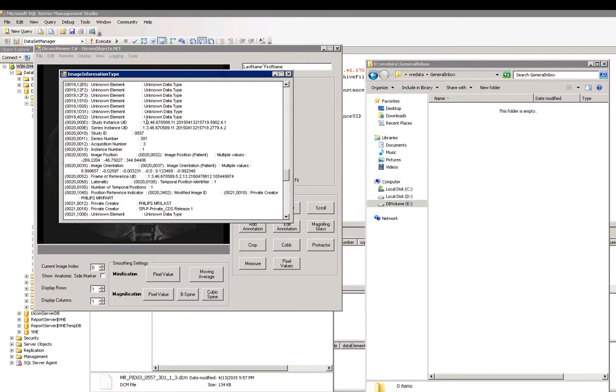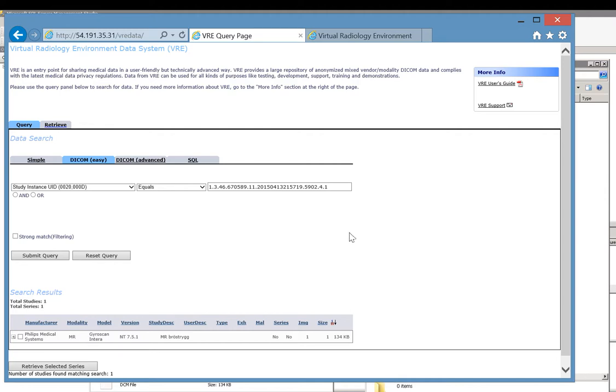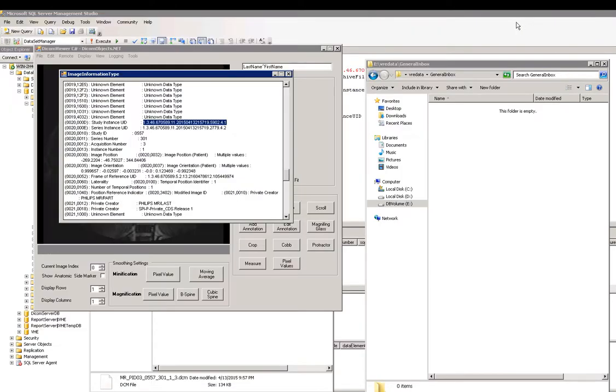to verify that the image doesn't exist in the system yet, although I have to move quickly because it's been reading it. Oh, it already got consumed. It's in the process of generating a thumbnail. Let's move on to the second file.